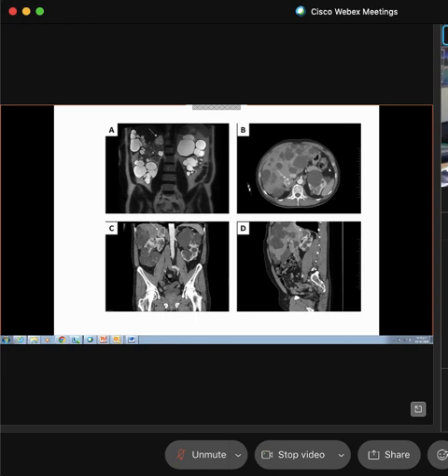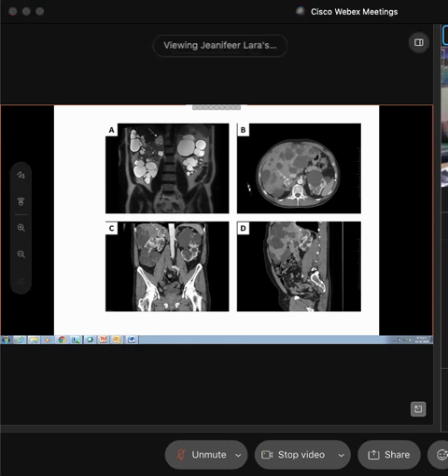Very good. I see a lot of axials, and that is absolutely correct. So we're going to spend some time today looking at some of the anatomy. This is obviously foreign to you, because we've been looking at radiographs holistically, where we see the liver and the kidneys and the psoas and the intestines, all superimposed on each other.